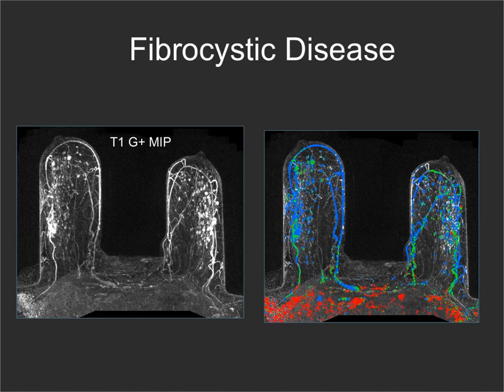Obviously, it's nice if this was not the patient's first breast MRI and you had another one to compare it to, but we're not always as fortunate as that. So again, you have to look very closely through these patients and really try and see, are there any of these areas which are enhancing differently than the others? Are there any black sheep there?